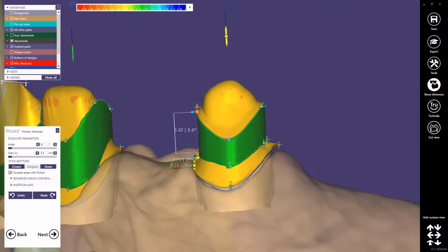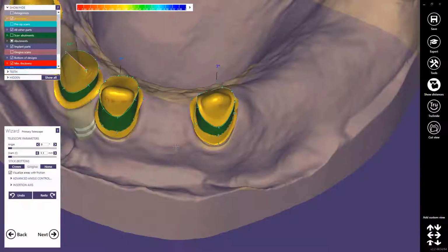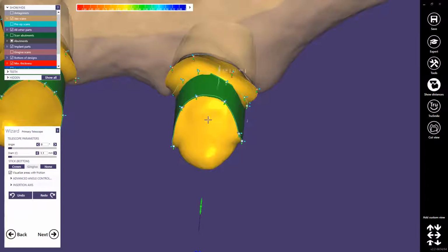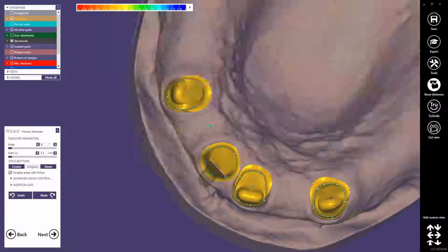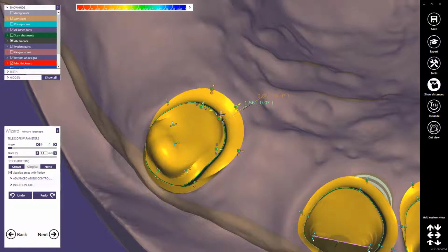Yeah, that's how I would design the core of my telescopes. And then at the end, on each telescope, I take Control and Shift and the left, right mouse, and I check again, or I make sure that my telescope is as thin as possible with such a blue arrow. You see that I can still save some space here. Okay.